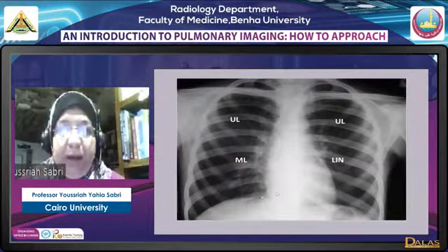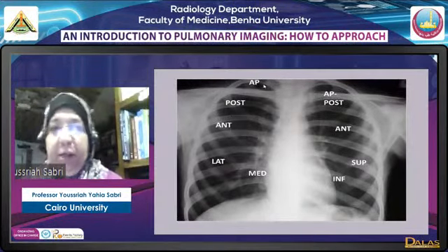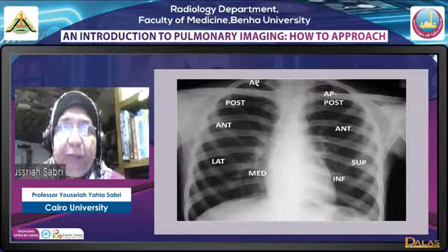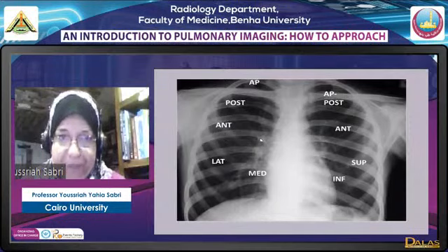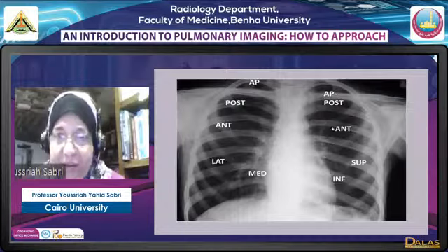Going to segmental anatomy, in the upper lobe we have عندنا 3 segments, triangular again in appearance, with the apex at the hilum and the base periphery. Apical segment is apically. Below it we have the posterior segment, وعندنا the anterior segment standing on the line that we have, the imaginary line that we have drawn. On the left side we have an apico-posterior segment in this position, and we have an anterior segment in this position.